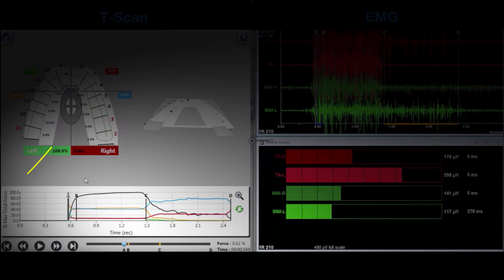The TSCAN studies relative force per unit time, force on the y-axis, time on the x-axis. First force contact indicated by A. All teeth forcefully coming together indicated by B. Excursion begins indicated by the C line. Posterior is no longer engaged indicated by the D line.